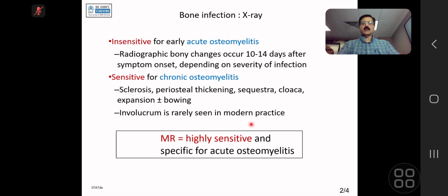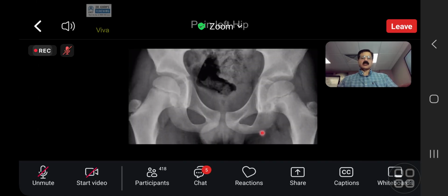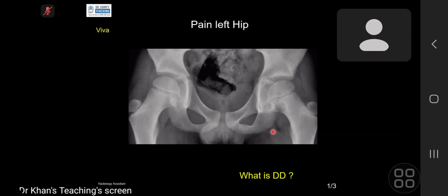So what do you think is the finding on the left side? Thank you. Frontal pelvic radiograph of a skeletally immature patient. There is a rounded lucent lesion within the proximal femoral neck, which is eccentric and close to the medial margin. There is evidence of surrounding sclerosis. There's no periosteal bony reaction or soft tissue component. On review of the remaining skeletal components, there are no abnormalities or similar lesions I could see in the femur, ilium, or the pubic bones. The femoral epiphyseal heights are preserved and are not collapsed.